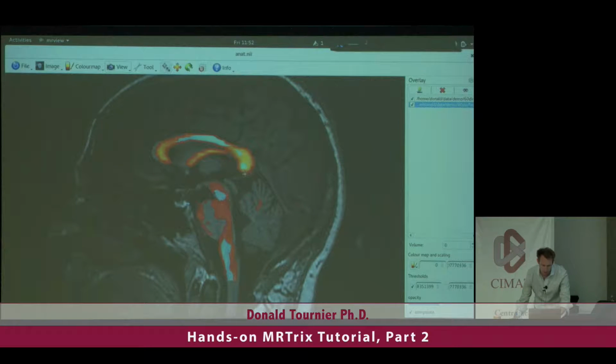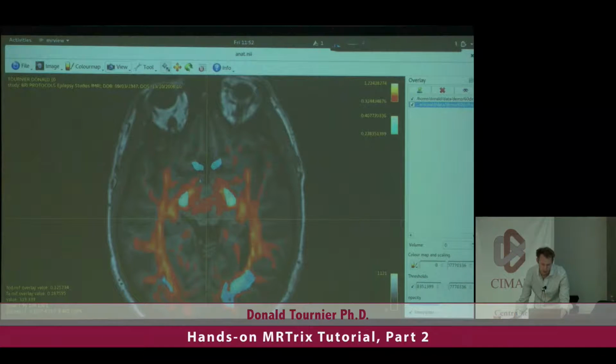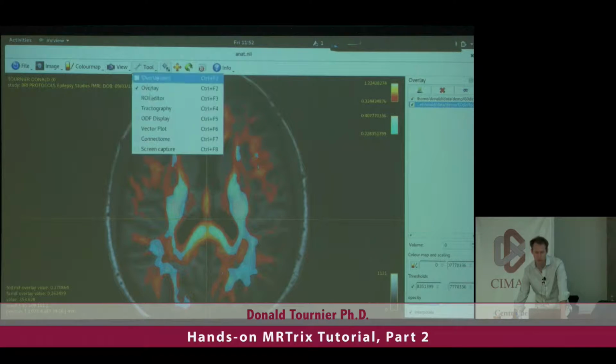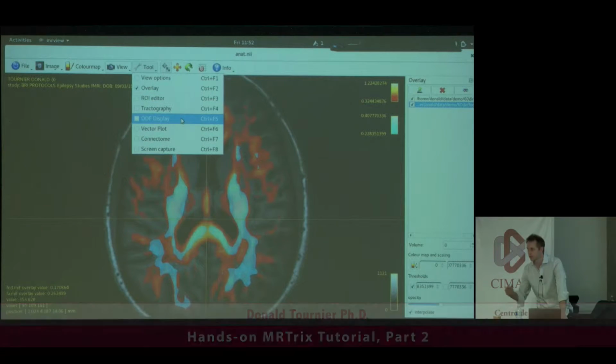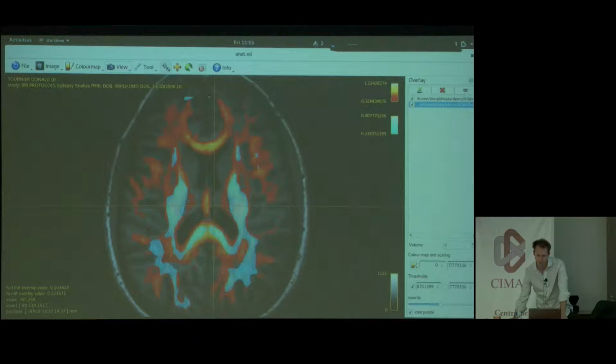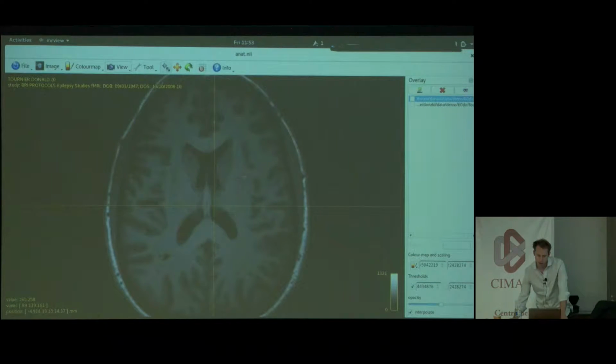So if you were interested in using MRView for other applications, it's entirely compatible. It's designed to be a generic, multi-purpose viewer, and then the tools is where we add functionality that is domain specific, but it's much more general than that. All right, so that's just one thing.